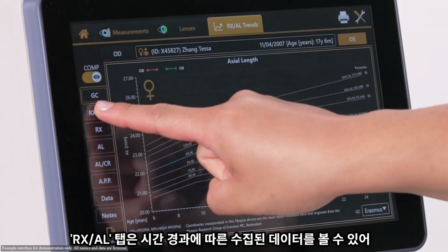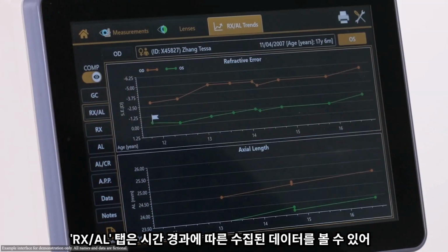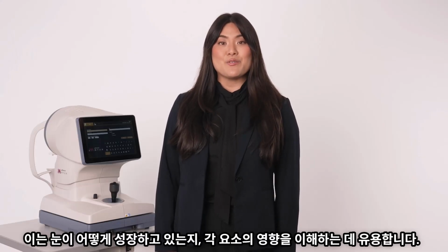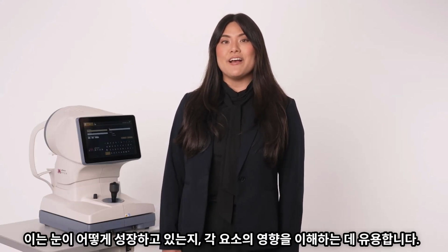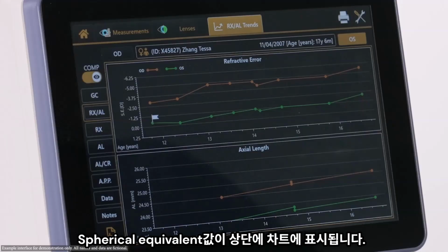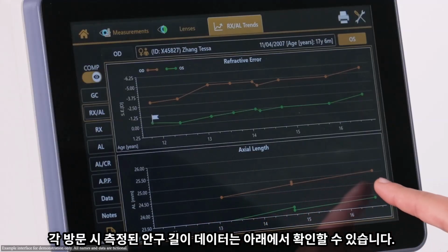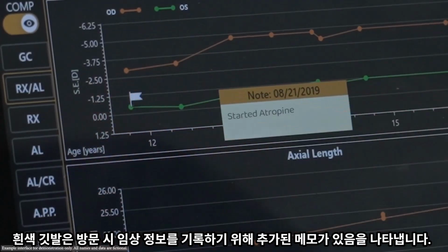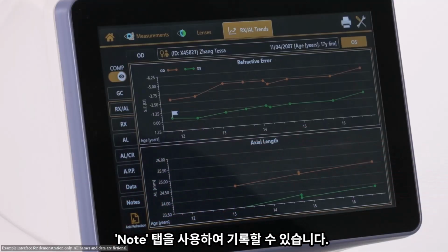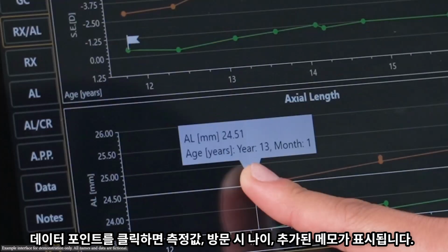The RxAL tab shows the data collected over time so that trends can be examined. This is valuable for understanding how the eye is growing and the contribution made by each element. If refraction data has been imported or added at each visit, the spherical equivalent will be charted at the top. The axial length at each visit can be seen below. A white flag indicates that a note has been added to provide clinical information relevant to that visit. Notes can be added using the Notes tab. Clicking on any data point shows the measurement and age at that visit, along with any notes added.